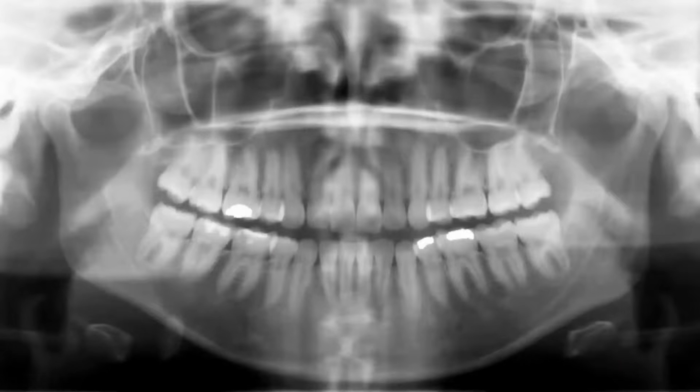We'll take this panoramic radiograph as an example of good exposure. Not perfect, but very good. Let's look at a few features. First, look at the orientation of the teeth. These teeth are separated by a few millimeters because of the bite block. The anterior teeth of both arches reflect normal size, not too large and not too small. The occlusal plane has a slight smile.